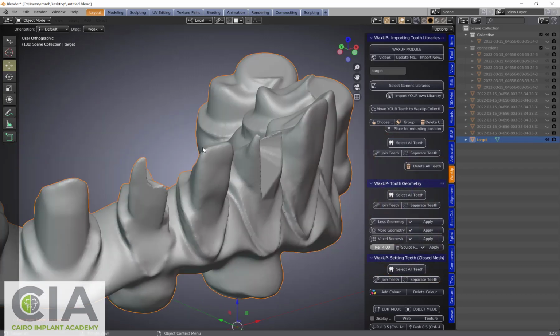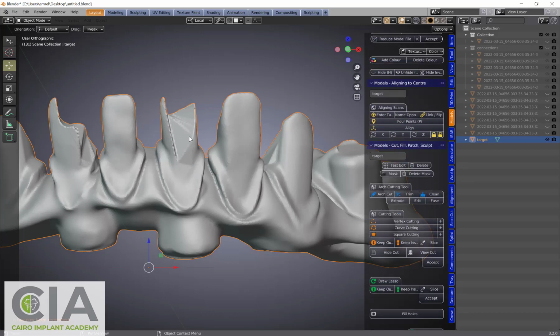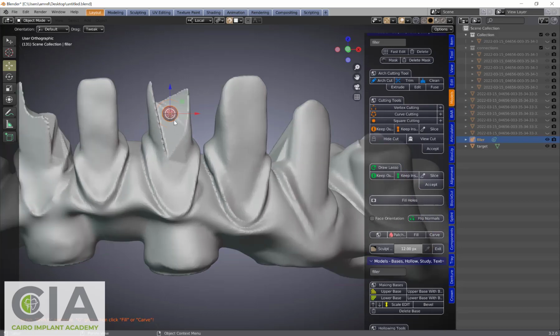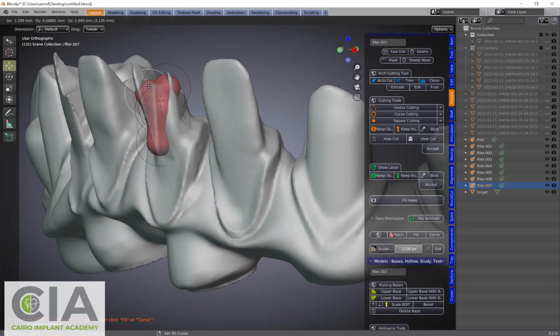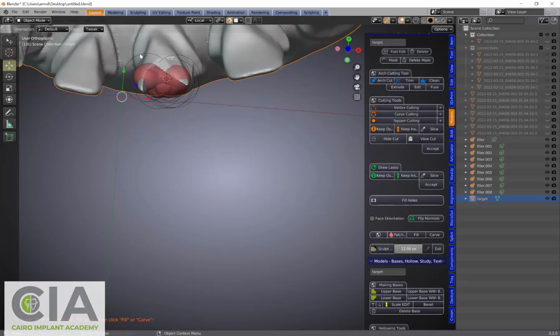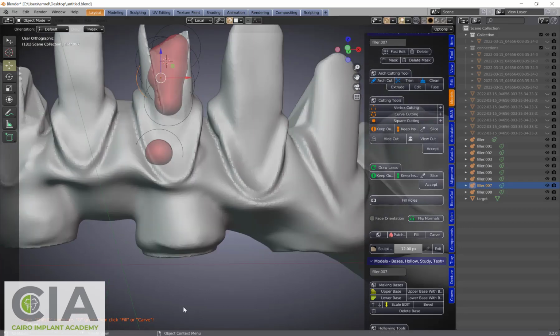The repair of those defective parts can be done either by the sculpt tools, or first we can build up a little bit here with the patch tool. Okay, probably I'll do a little bit of scaling, then Shift D and start using it as a dropper to build the defective parts with a little bit of excess. Little bit of excess.